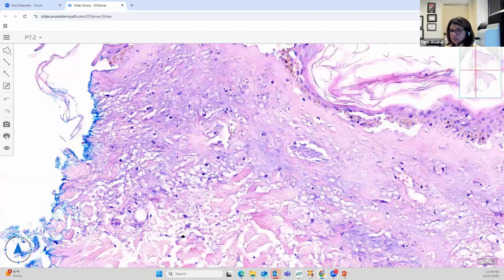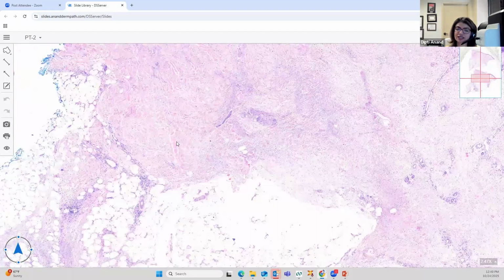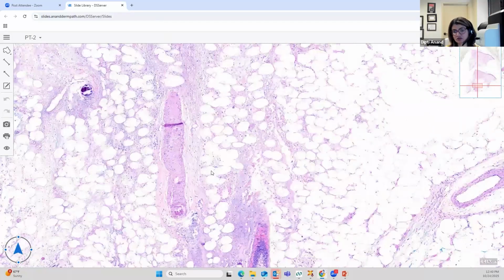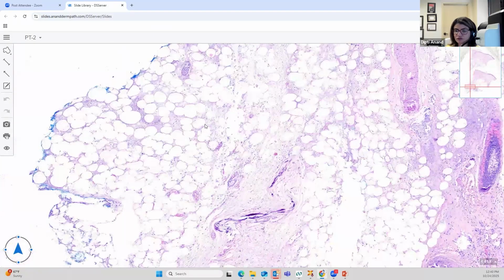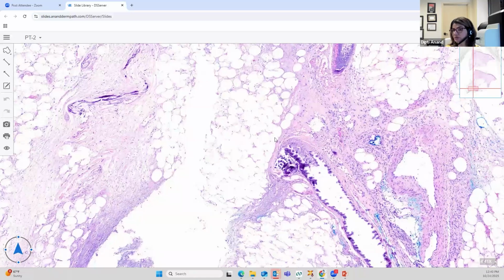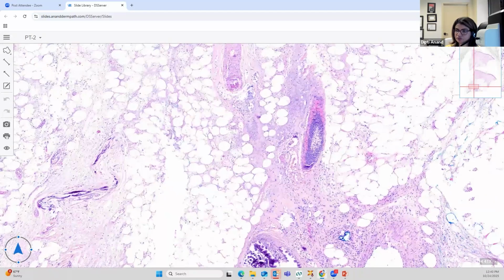It becomes this basophilic debris with neutrophils. That's all indicative of what you see in calciphylaxis. I'm really stressing on that because this is a really important point to make, because you absolutely have to see this pattern of dead fat, withering fat, along with the calcium deposition to be able to diagnose calciphylaxis. So this is the first type of fat necrosis.